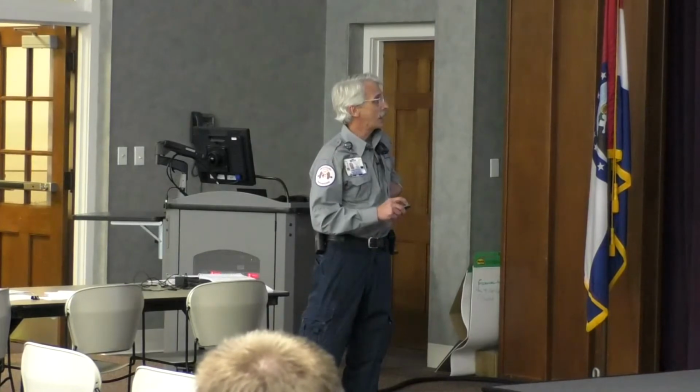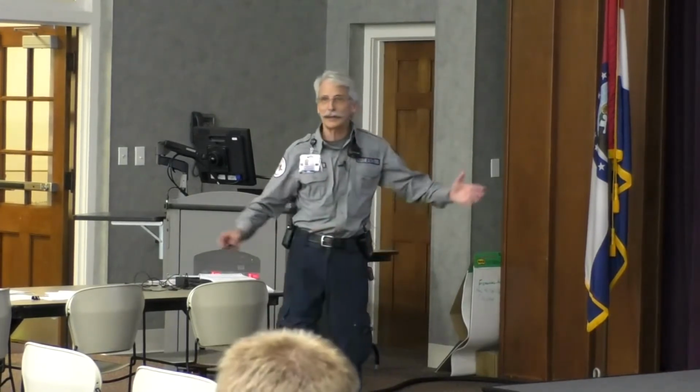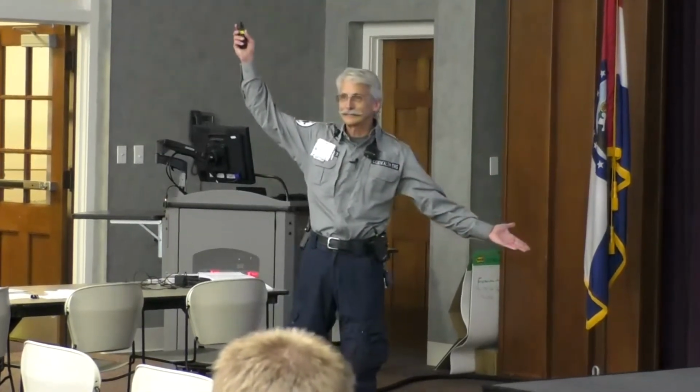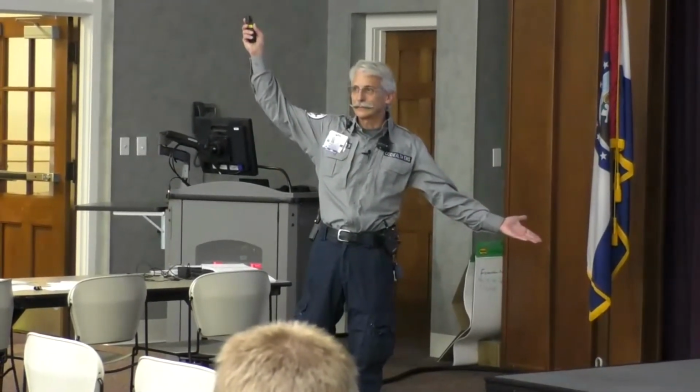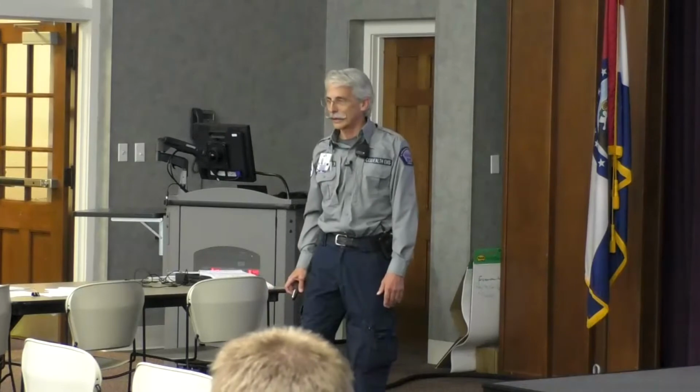And we also have reciprocal changes in 2, 3, and AVF, the other side of the teeter-totter. Okay? So this person's showing everything all over the place. And they have the widowmaker going on, a global MI.